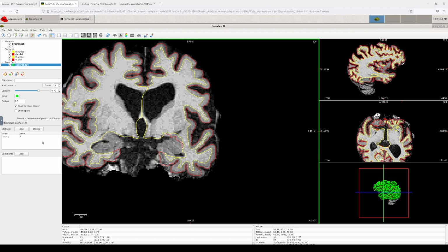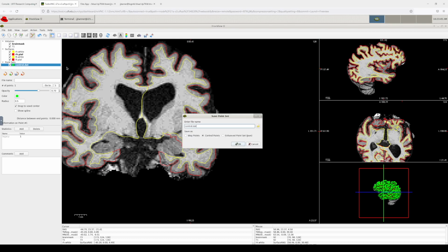It should automatically save, but I don't want to assume that it's going to automatically save. And so then I can click on save. Let's say I went through, there was this one area, and I can save that. So that's what that process would look like.